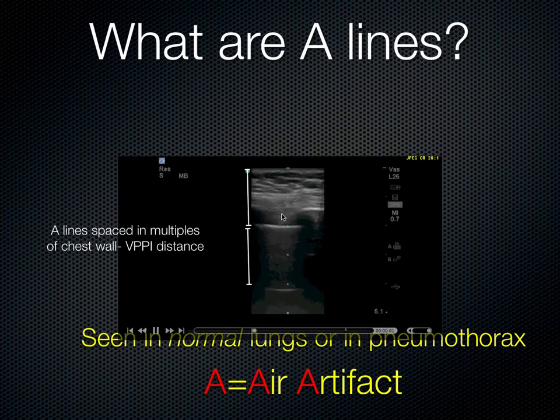The distance between the skin and the pleural line is reflected again from the pleural line down as the same distance. This is because these ultrasound beams that come here and get scattered back up to the probe, that delay in return, the probe reads as something deeper.